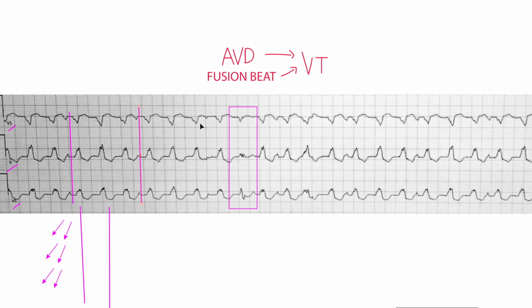And here's another one that I didn't see initially. See this one right here? Oh, actually, I did see that one. Well, maybe not. Doesn't matter. The point is, whatever this anomaly is, it's showing up in all of the leads. So it's not a fluke on a single channel, somebody tapping on the wire or something like that. It's real. And I would say that, yes, indeed, we do have atrioventricular dissociation. We do have a fusion beat.